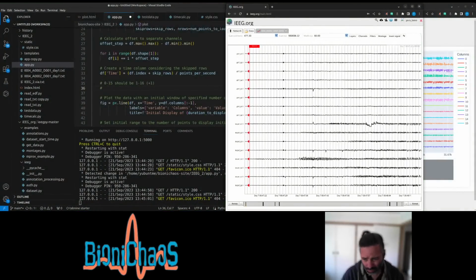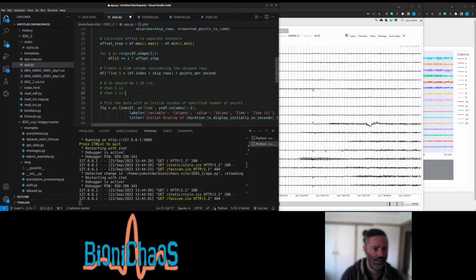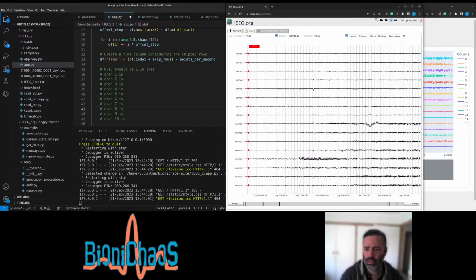So by the looks of it, channel 1 is 8. Can't copy that, channels. So this would be right of 1.